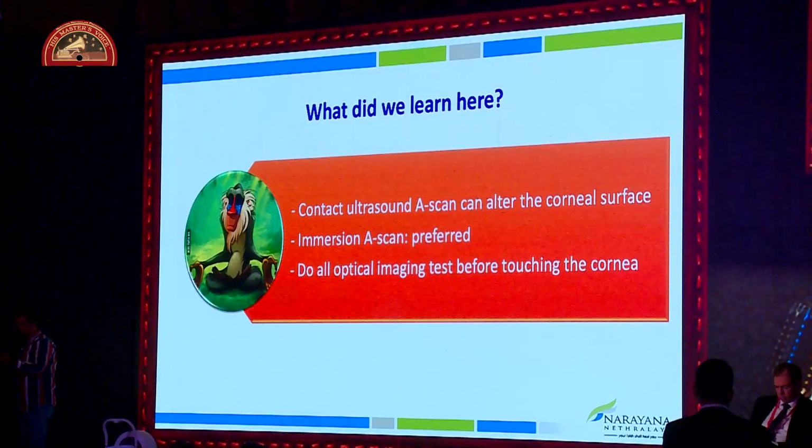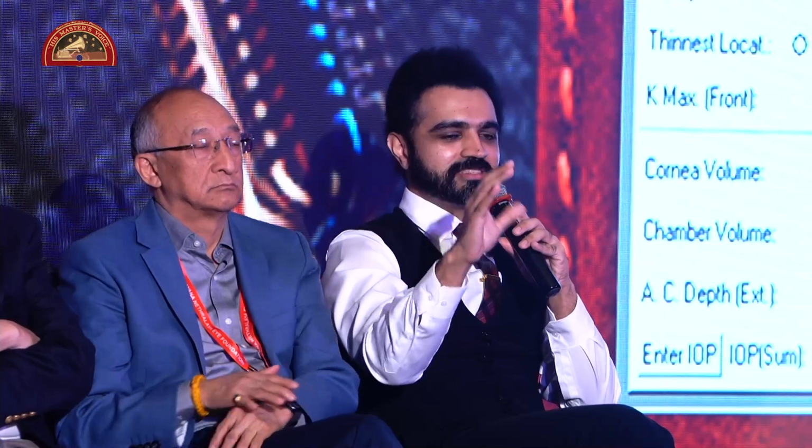And usually this happens in a teaching institute. Even though you have created a system, one enthusiastic new PG or fellow, seeing what looks like high IOP, simply does the GAT without telling you, and then goes for the rest of the workup, and you're just looking at the scans and interpreting. So it's very important to keep all these things in the back of your mind. The story can be a little different from what the scan is actually showing.